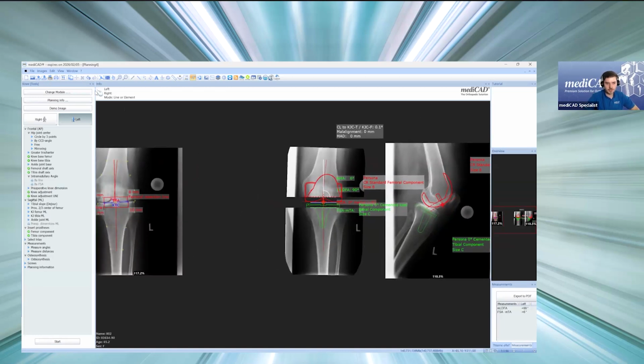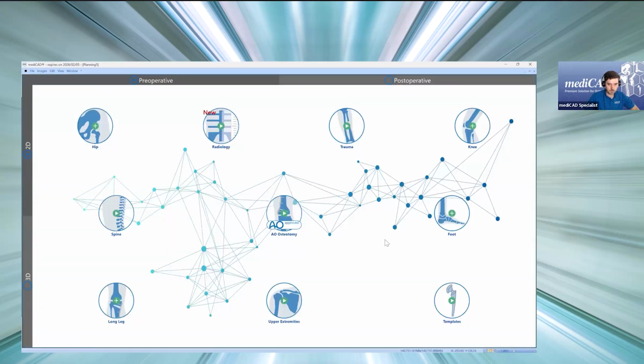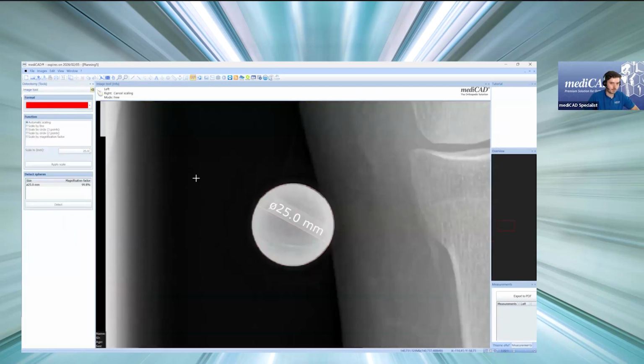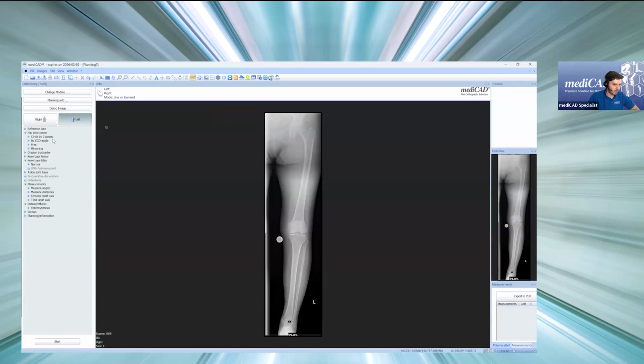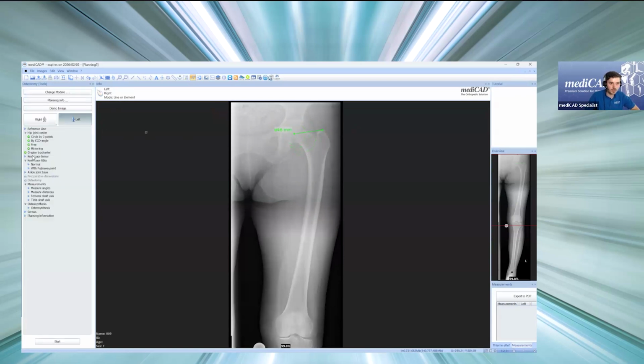We will now go into osteotomy, as I mentioned before. So again, we'll start with this hip joint center, circled by 3 points. Now, which is also a new addition, this is also for knee and osteotomy.